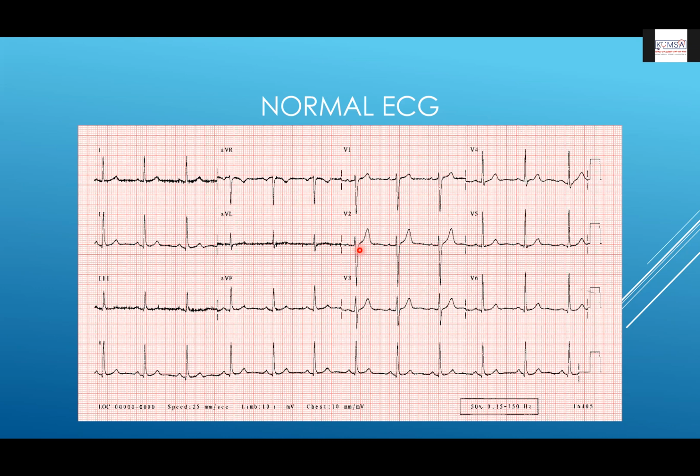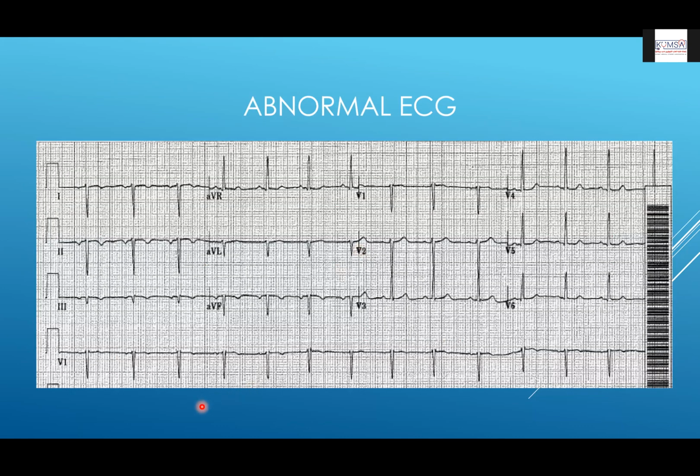Now this is an abnormal ECG, okay? Abnormal in a couple of ways. So we see that there's a negative lead 1 and a negative lead 2. But also, what we see is that V5 and V6 are positive. So V5 and V6 are receiving the electricity. So it's all towards the heart, but lead 1 is negative. So we're getting conflicting information here.